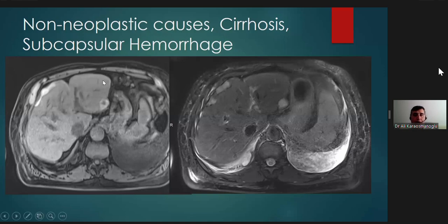On MRI, pre-contrast, you can see the liver is obviously cirrhotic, right? The caudate lobe appears slightly prominent, the liver contours are irregular, there's a posterior hepatic notch sign. So this is typical chronic parenchymal liver disease.